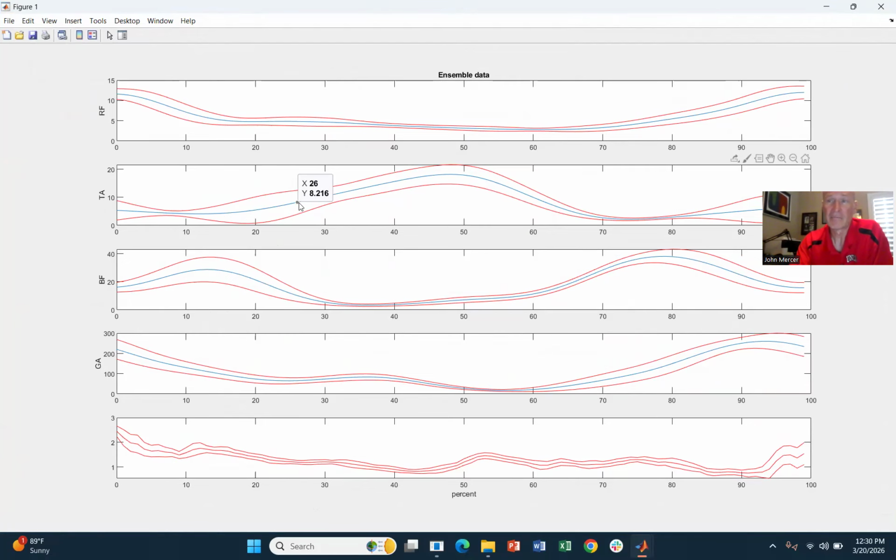That's by design because we are trying to make sure that we're representing overall the muscle activity during running. And maybe one stride isn't different enough to really draw our attention. But nevertheless, that's what we have now for our plot for muscle activity patterns.